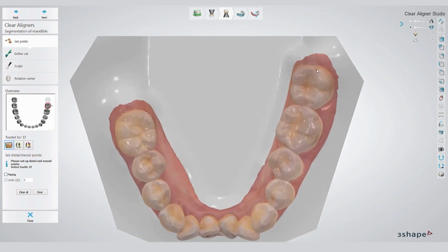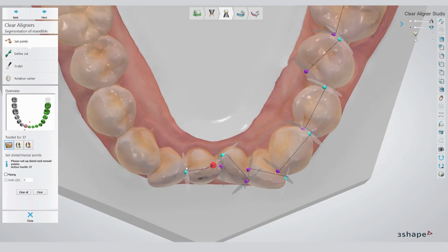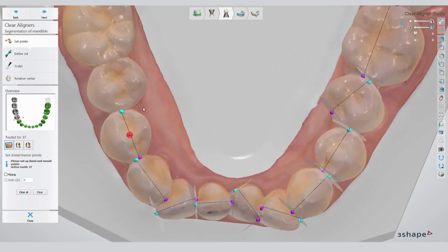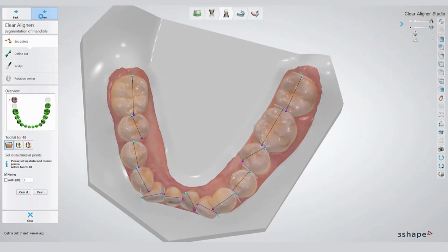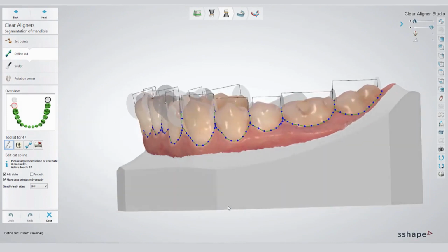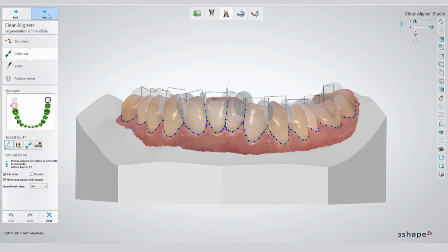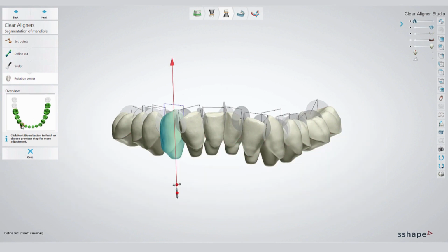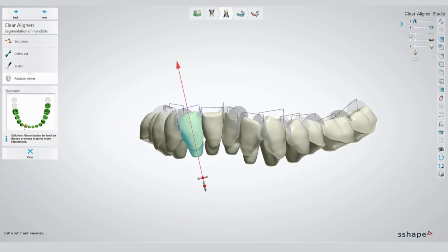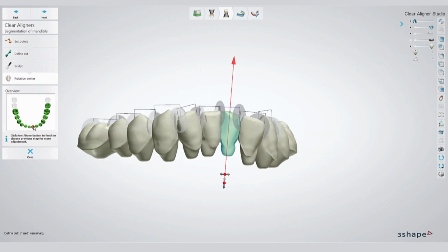We still have to apply the same process on our mandibular arch. We start again with selecting the distal and the mesial end for each tooth. Once you've finished with this process, again the software will automatically detect the marginal line. You want to double check this one as well. If you click on Next, you will be guided through the sculpting process, and finally you want to double check the long axis for each individual tooth and probably correct it if necessary.